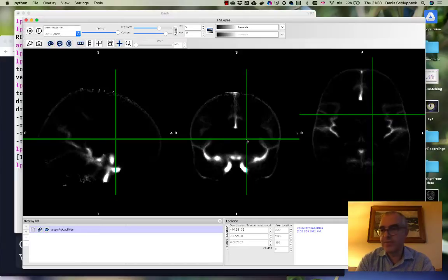All right, so I think the best way to think about it is as a display phenomenon, because we're changing the image in such a way that the darkest thing is still at 0, but now the brightest pixel that we render is at 25. So we're using all the possible colors that we have to display things between the probabilities of 0 and 25, and 100, which means we can actually see all of those fine gradations.